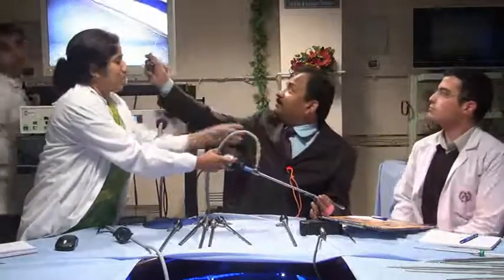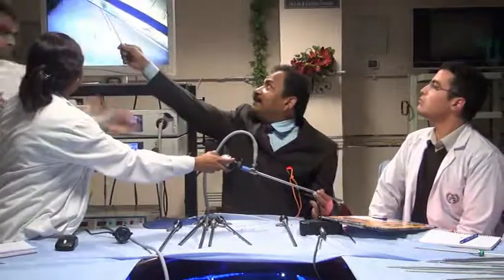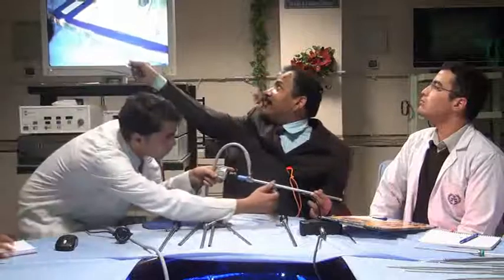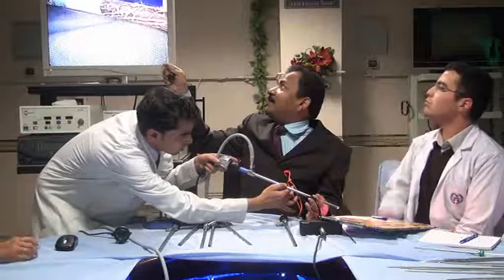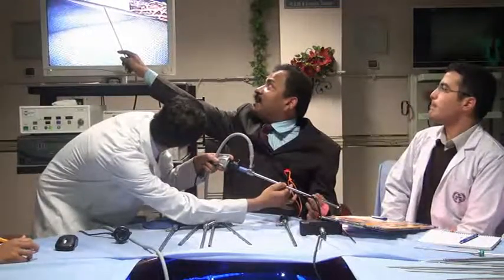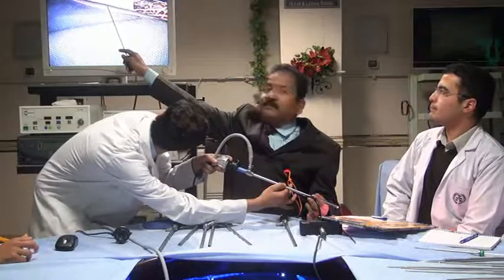So, see here. This is shadow. Can you see that? And here the shadow is thinner. And if you see this side, the shadow becomes thicker, wider. Here is also shadow. This is also shadow. Can you see the shadow? The cardboard shadow on the paper.